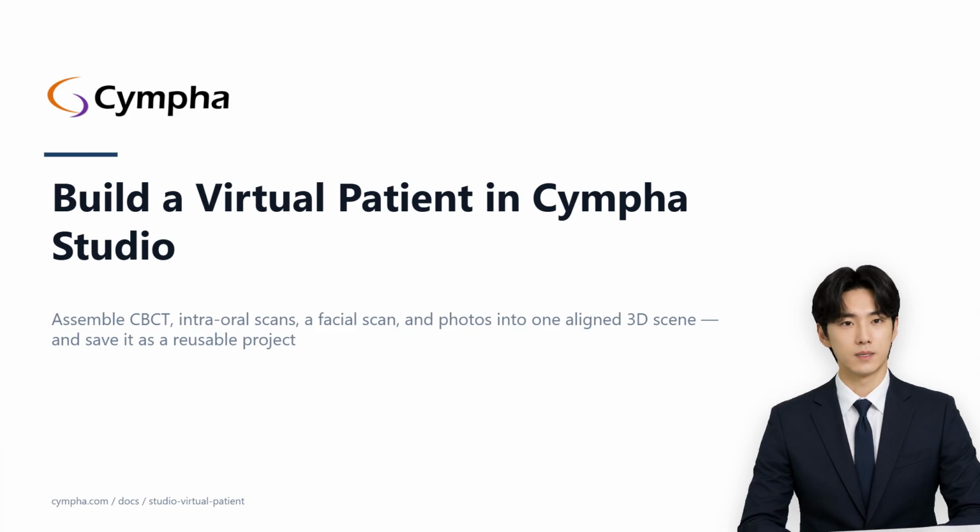Plan on 15 to 25 minutes per patient the first time, and about half that once the workflow is muscle memory. Follow along on screen, or just listen now and read the written guide later. Let's build one. Let's define the goal first.